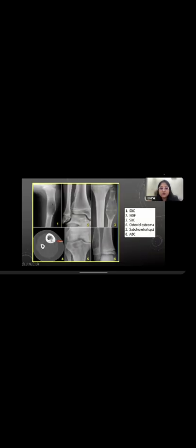Now see examples of simple bone cyst: a well-defined lytic lesion which is expanding the bone in the diaphyseal region, and it has a narrow zone of transition. You can see very well the difference between normal bone and where the lesion starts. There is no ambiguity about it. There's no cortical destruction, no soft tissue mass associated, no periosteal reaction, much more inclining towards a benign etiology.